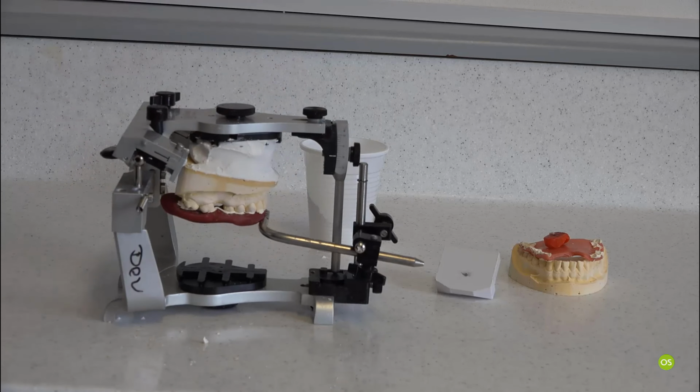Now that will do, and we now let it set. Do not touch. You don't need to put anything on top or anything like that, because you mixed a really runny mix. It will set perfectly and it will not expand massively.